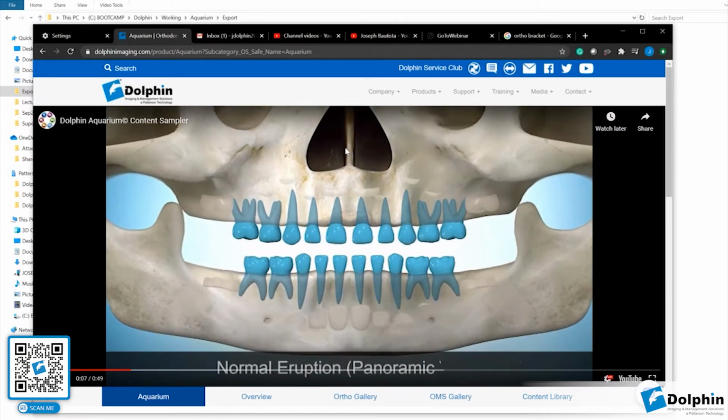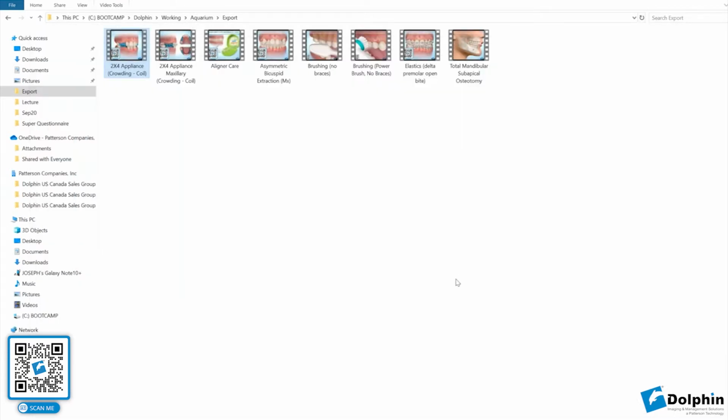So as it's exported as a Windows media file, you simply hand over these videos to your web developer, and they would go ahead and handle the rest.